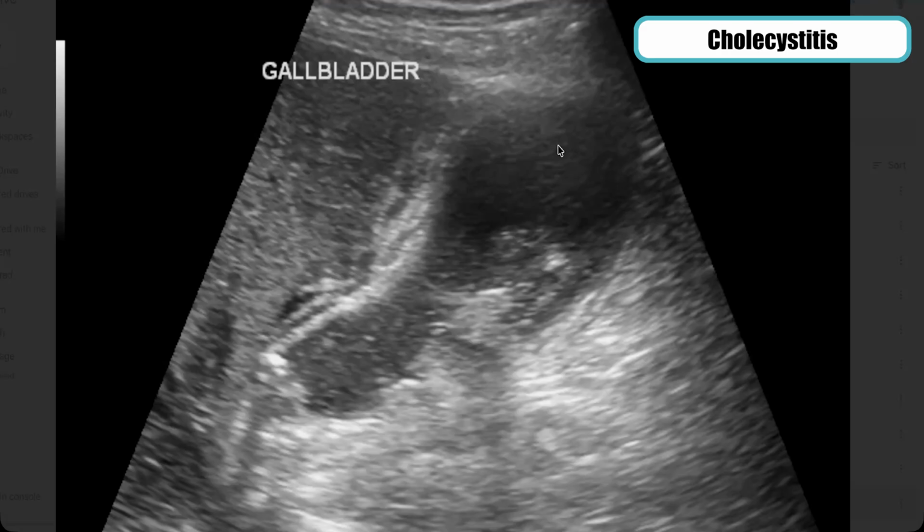You need to be able to recognize this empty cavity here. There's really nothing in the cavity of the gallbladder. And then it forms kind of the neck where it would empty out into the cystic duct right here. It's a bit grayer over here, but lighter, and then a little darker up top. So darker, probably empty. This lighter gray might actually be biliary sludge. It's not quite a stone. It's not quite normal bile fluid. It's somewhere in between, just a little more dense.